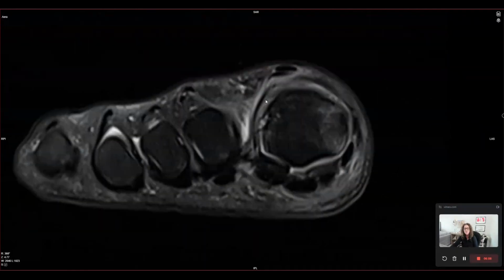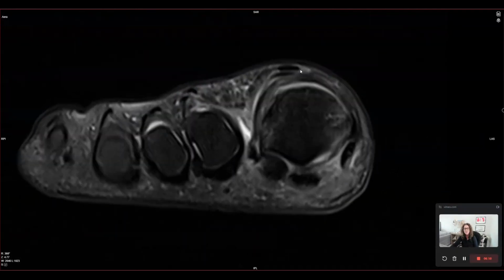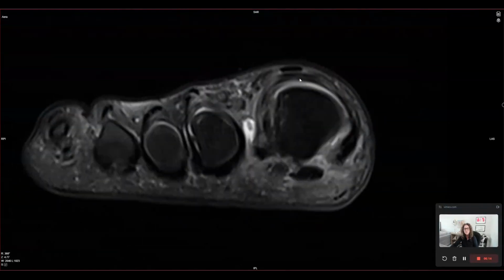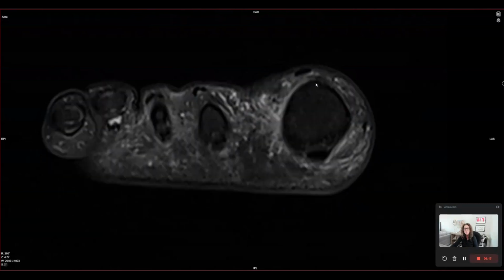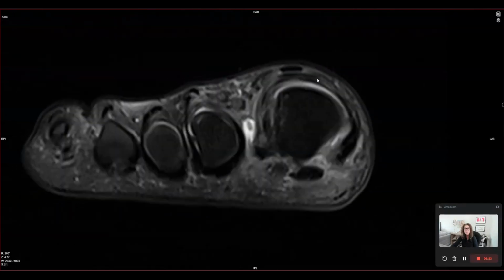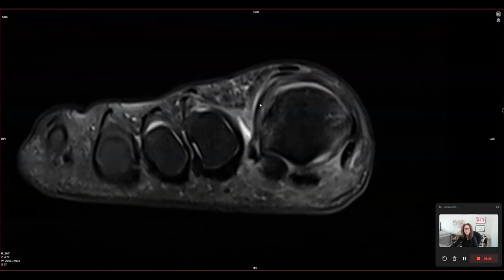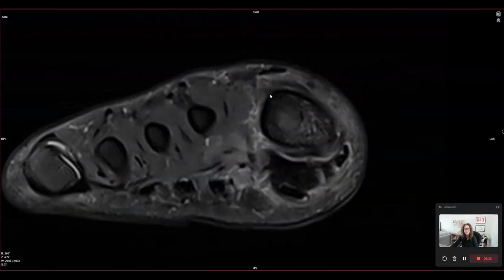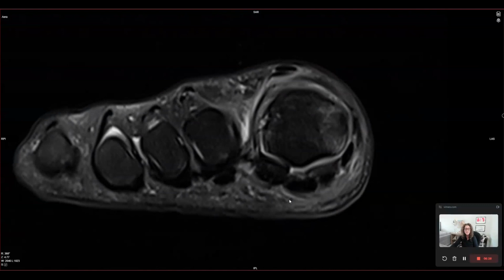To complete the reading, let's look at the extensor hood, the extensor hallucis, the extensor digitorum brevis, normally attaching into the joint capsule and also to the proximal phalangeal base, all intact. We can see that the region of the transverse retinaculum moving to the sagittal band is intact with mild poor definition there, consistent with mild sprain, no laxity of the tendon. So this is a fantastic case.